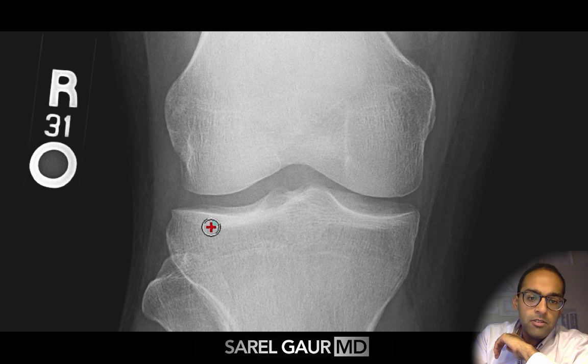What are those fractures? Basically, a subtle fracture of the tibial plateau. That really comes to mind. So I'm really scrutinizing this tibial plateau, looking for any subtle break in this, any crack in this, any depression of the articular surface, or any area of sclerosis within this marrow bone, because that could be an early sign of a fracture. I'm also doing the same thing looking at the fibular head, and I'm kind of looking in this general lateral joint line region, because this is a common region for avulsion fractures.